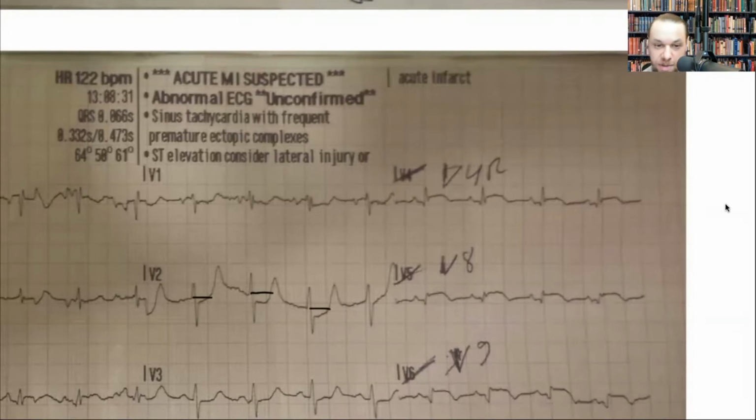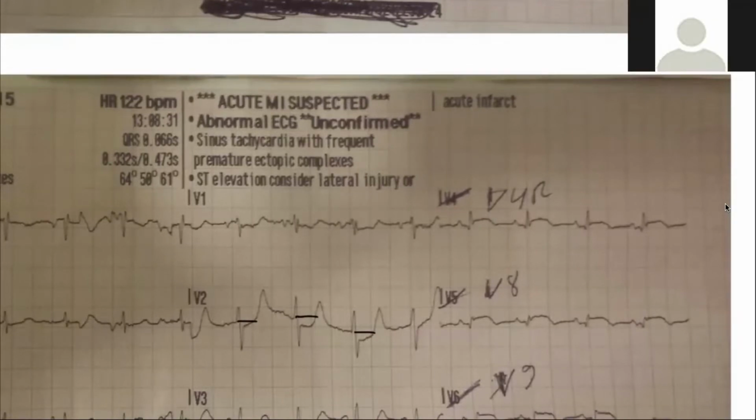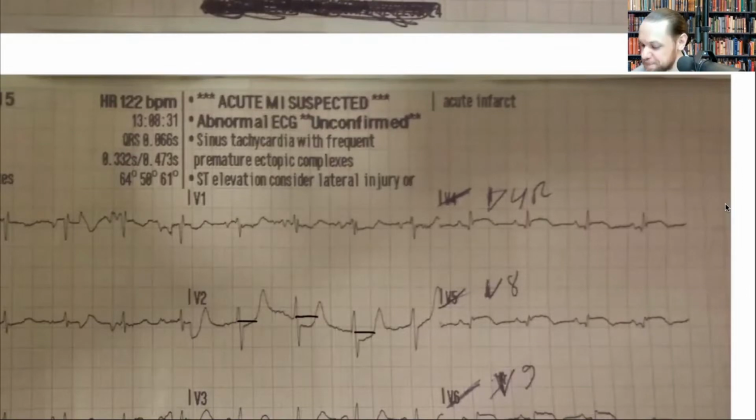So we always have serial EKGs. These are all depressions, because if I draw my T to P, remember I said it's T to P for the isoelectric, but yeah, this was just patient movement. When you put your leads on the patient and they're in significant pain, you could tell them to stay still, but they will move.